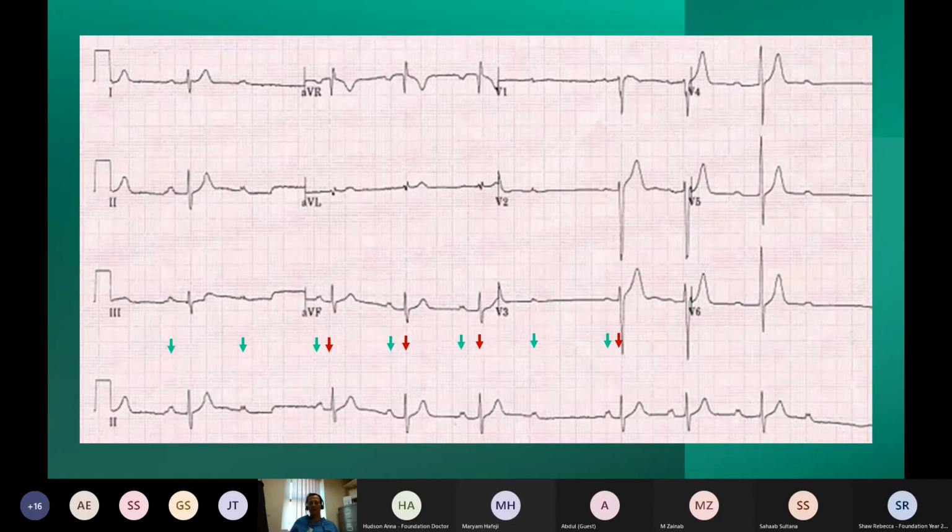But the reality is that if an elderly person is doing this at rest, they've probably got something wrong with their conduction system causing it. If a young person's doing this a bit at night, then they've just got high vagal tone and it's a natural phenomenon. So Wenckebach at night in a young person, nothing to worry about. If you're in your surgical pre-admissions and you pull off this ECG, they're pretty bradycardic. They've got Wenckebach at rest. Maybe there's something that needs pacing here. So this certainly should merit some further investigations. So does that make sense to everyone?